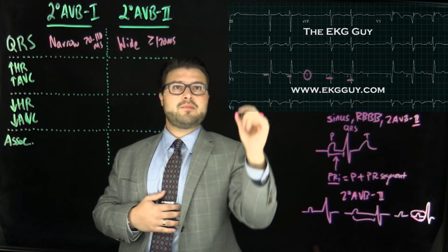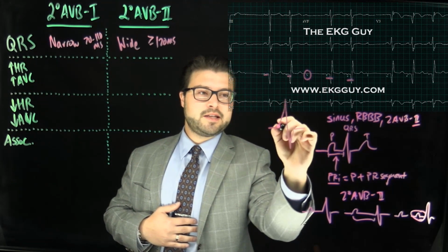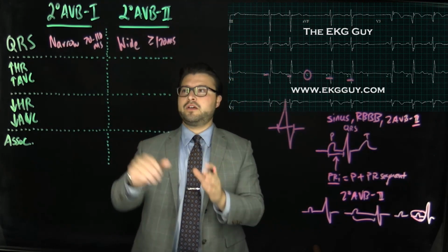And so when we talk about the duration of the QRS complex, imagine here's your QRS. That's from the beginning to the end. So that duration is what we mean here.